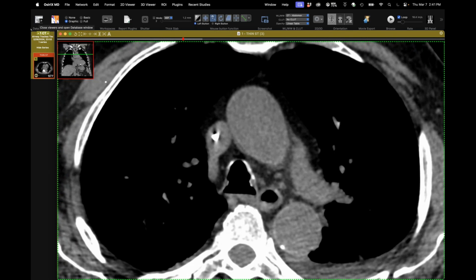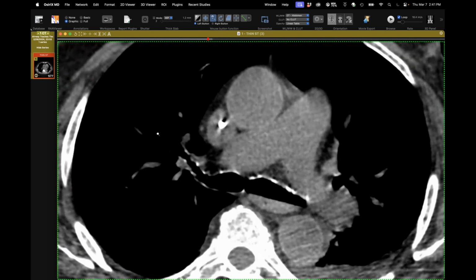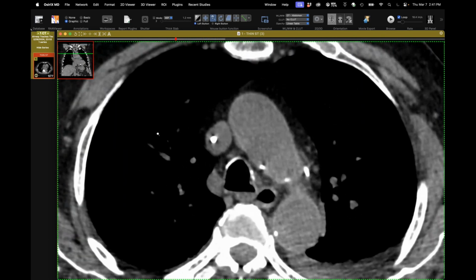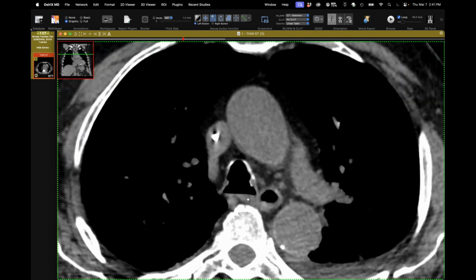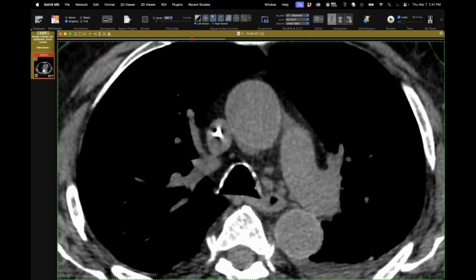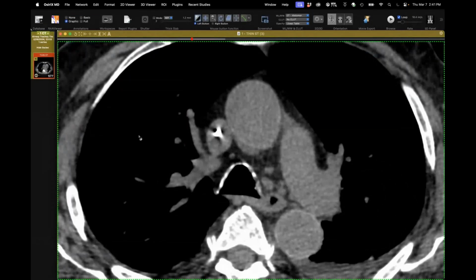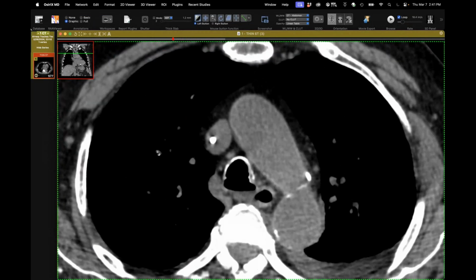Does it go to the main bronchi too, Jeff? Not really, which keeps with what I've seen when I see the small bumps. You'll notice it doesn't involve the posterior membrane at all, which is typical of it. So the bronchoscopists have told me that sometimes they'll see mucosal irritation over those bumps. Mm-hmm. So I think they probably snag some secretions or something like that and it can get inflamed. Yeah, and usually they're not calcified. Usually they're just little smooth bumps.